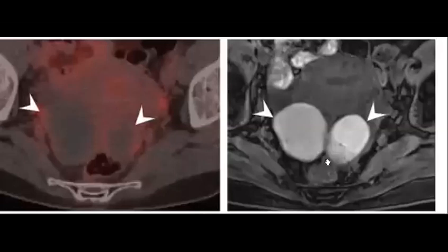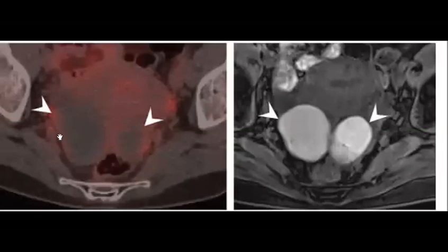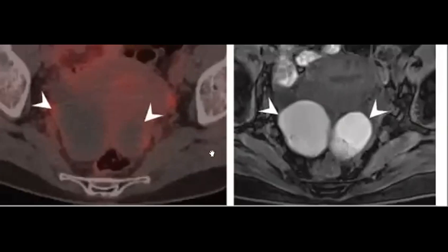So maybe in the MRI, you can see that there are bilateral masses. And in the PET CT, you remember we mentioned that the uptake surrounds the lesion. So the center, we called it what? If you describe it in terms of hybrid imaging, we'll describe it as what? Photopenic, perfect, Nermin. And Rihan, perfect. So it will be a photopenic center.